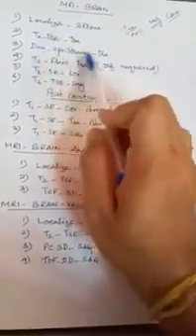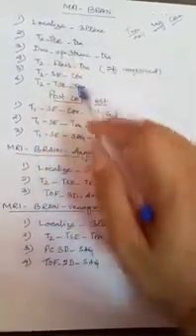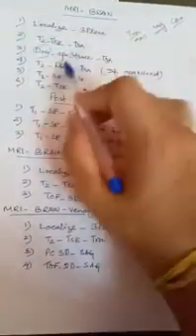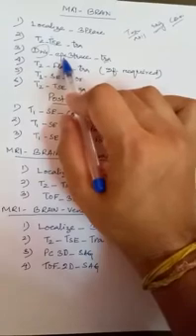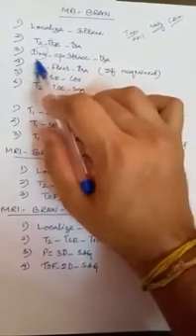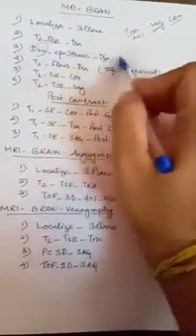Okay. Then we are using DWI EPI 3 tra. So basically you have to know DWI. You are using the DWI axial. Don't be confused about EPI. EPI means echoplanar imaging. That means the echoplanar sequence we have to use. DWI means diffusion weighted imaging. The diffusion weighted axial sequence we have to take.